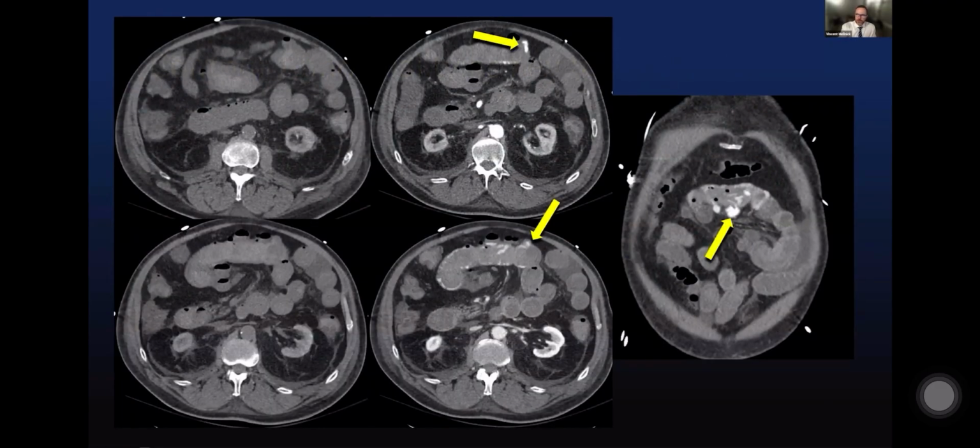Another patient with a contour abnormality of the small bowel, multiple outpouchings here. In this case, I'm not showing you that to demonstrate the wall so much as the contents of the small bowel. Let's take a step back and look at this pre-contrast scan, which demonstrates distended bowel with high attenuating material that's higher in attenuation than the muscle. After administration of contrast, we see brisk extravasation into the lumen that spreads out over time and fills these diverticula. So we're very confident we have bleeding small bowel diverticulosis here.